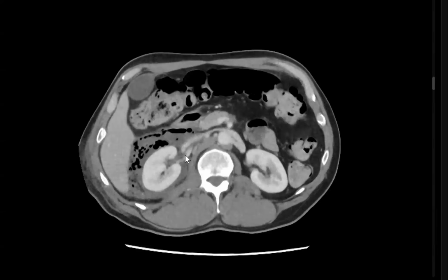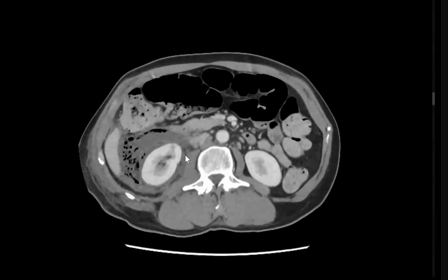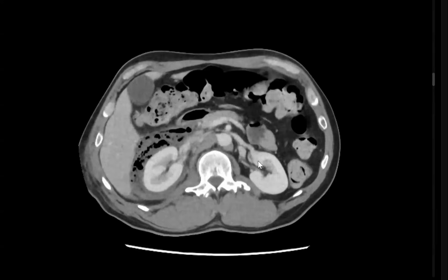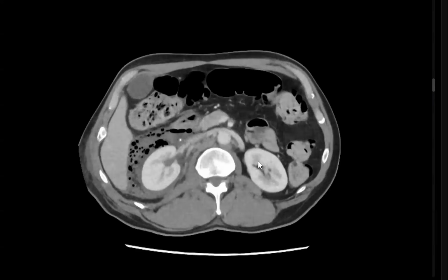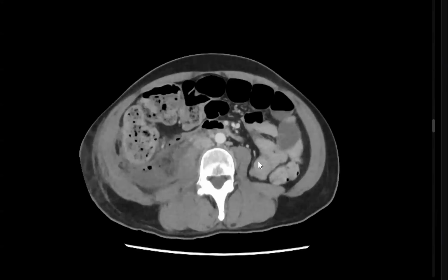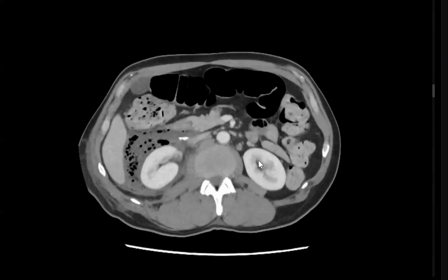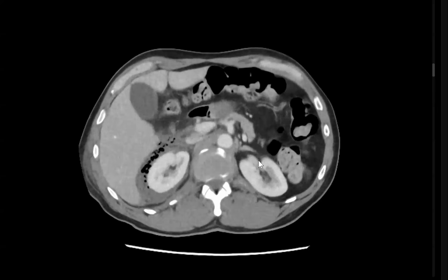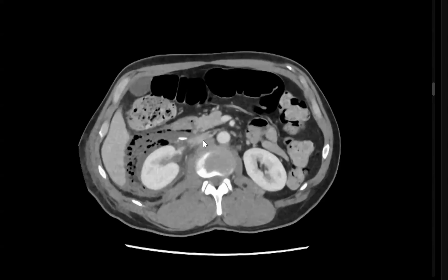Good. Retroperitoneal. So I am looking for any retroperitoneal structure which can be ruptured. So I will look for the duodenum. It's unlikely to represent a condition related to the urinary tract, because the right kidney is seen very well, perfectly enhanced, with no intraparenchymal gas. Very good. So what are the retroperitoneal structures?